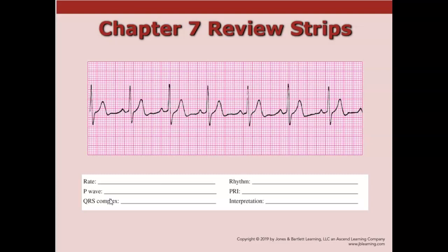Regardless if you mix them and match them, as long as you do the 5 steps, that's fine. So you see on this one, it has rate and rhythm at the front. The book that you've been reading talks about the rate and the rhythm at the back. None of that matters. I do it in rate and rhythm at the front, but as long as you do all 5 of those steps, that's what matters. So let's just go ahead and get started.